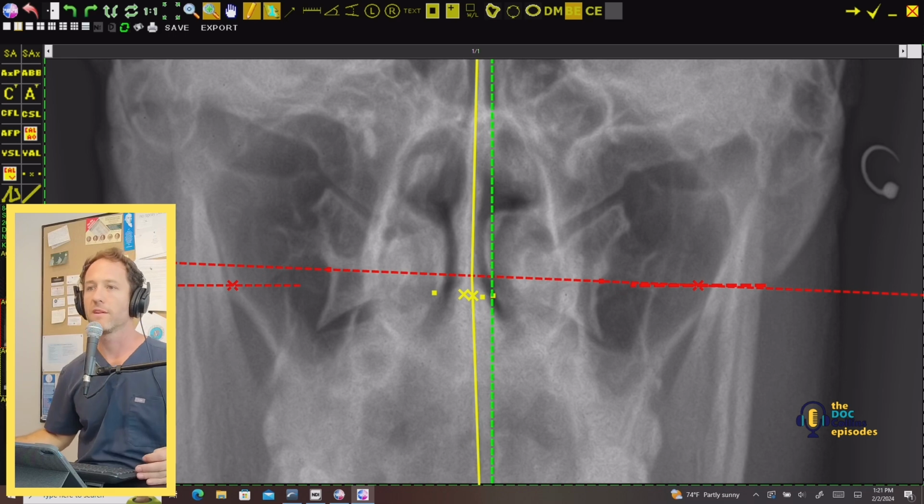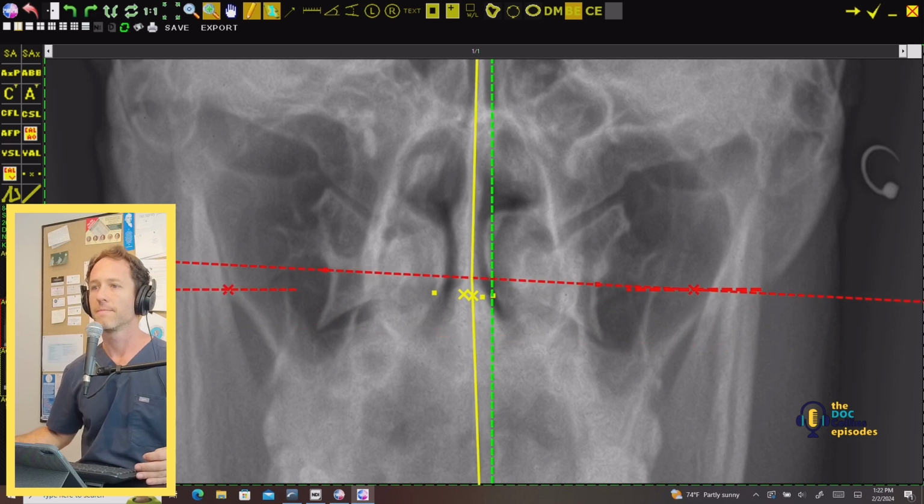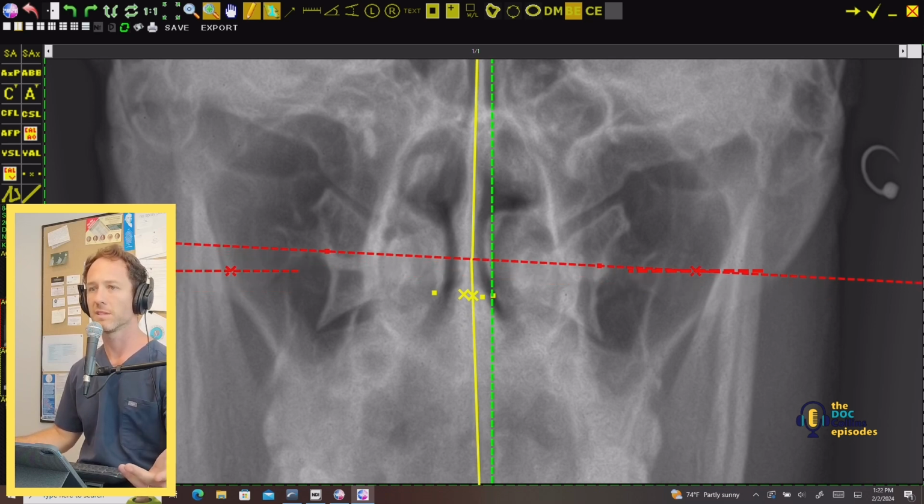So just in workflow, I start off with that inferior aspect of posterior arch, and then I'll kind of roll it up to those superior tips, and then down, and start to see if there's some sense of congruency. Lastly, let's say you got 4 references there, split 2 and 2. From my understanding and how I've practiced, you take the one that does include the inferior aspect of the posterior arch. You still weight it more heavily if it's a split decision.